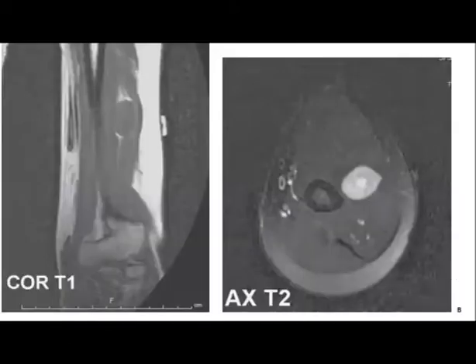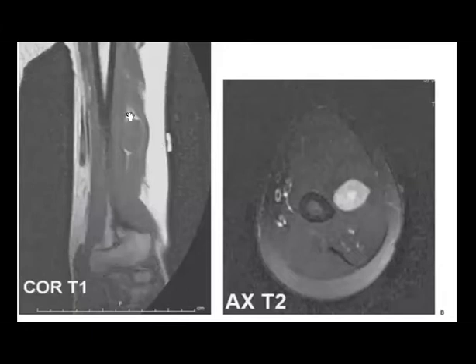I think, okay, we can take this one. Before you start to describe, check first which sequence you are looking at. So this is T1 and this is T2, and you can find that it is very high signal in T2. So I agree with you, Nirmeen, Ala, Shayma, Dok, again Shayma.